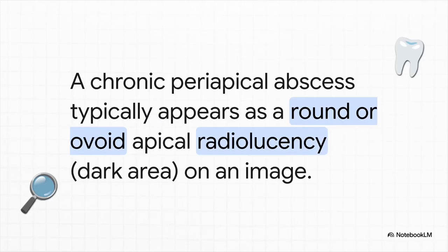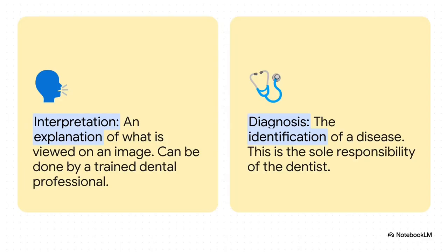And here is a textbook example. A dental abscess, which is basically an infection at the very tip of a tooth's root, destroys the bone around it. So in an X-ray, it shows up as this distinct dark circle, a radiolucent spot, right where there should be solid, healthy white bone. It's a dead giveaway that lets dentists find these hidden problems deep inside your jaw. You know, this brings up a really important point.